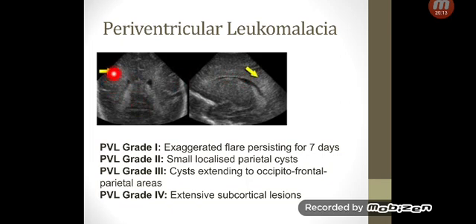It is where it should be, on the side of the posterior horn of the lateral ventricle, both on the coronal and the sagittal view. It is less pronounced or equally pronounced in echogenicity to the choroid plexus, which is a very important marker. And it doesn't have any cystic formations, so that's how you know it's a normal flare.